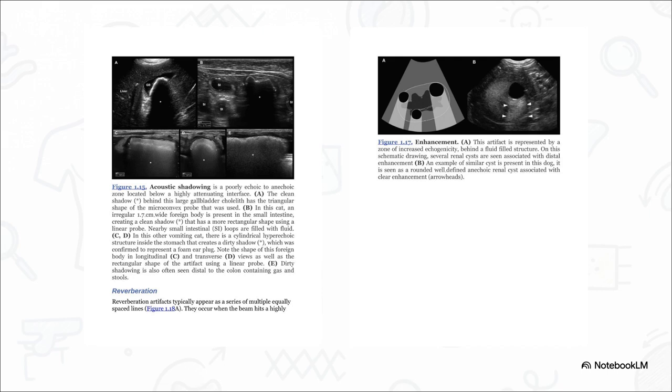But now compare that to a fluid-filled cyst. This is a poorly attenuating structure. The sound just zips right through it way easier than the surrounding tissue. As a result, the echoes coming from deep behind the cyst are unusually strong, and the machine ends up painting this bright white spotlight right beneath it. And that is what we call acoustic enhancement.